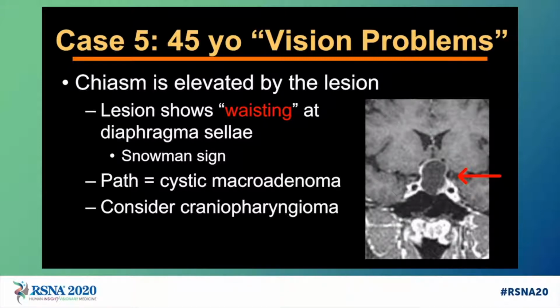The diaphragma sellae is a dural reflection that covers the sella. Now, this appearance to some people suggests a snowman. On the other hand, in Tucson, Arizona, we don't build very many snowmen, so I'll leave the snowman sign to you.